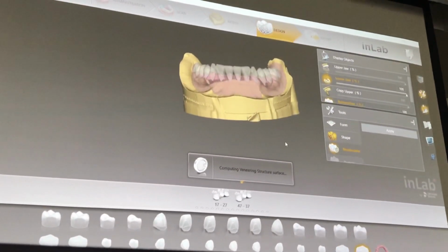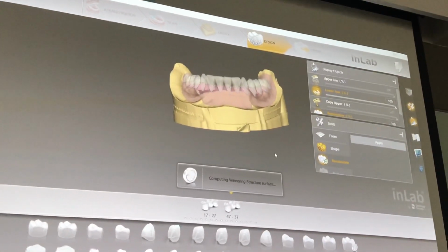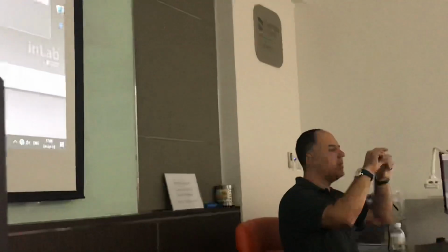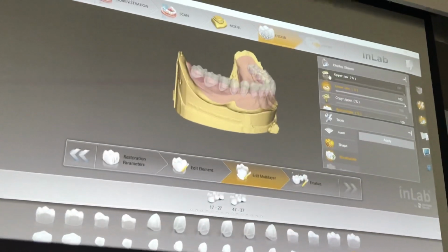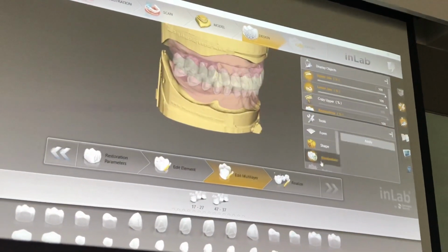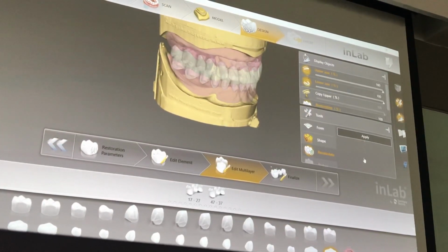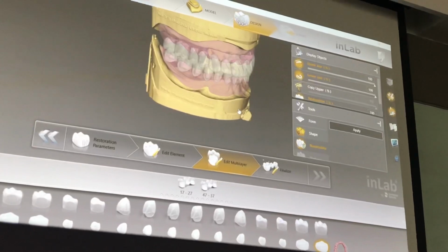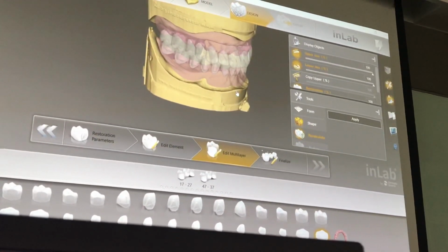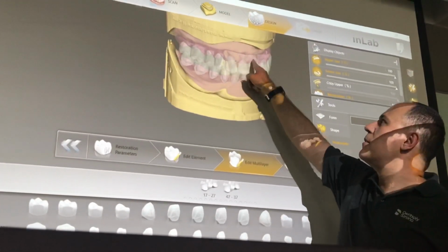All right, so when you say edit multi-layer, what it does is you've got the gingiva with preps, right? And then all we need to do is actually change, recalculate and apply. Okay, my software is non-responsive. So what I wanted to show you is that if you look at this now, that area there, my preps are gone, right?